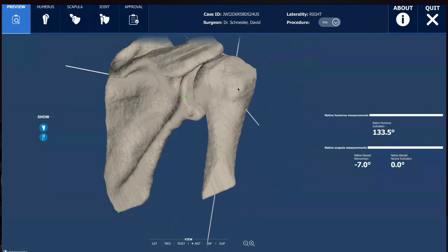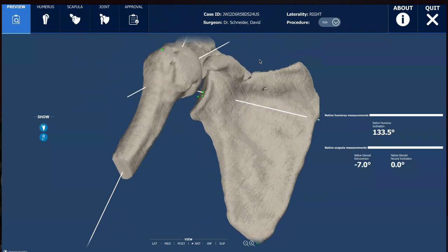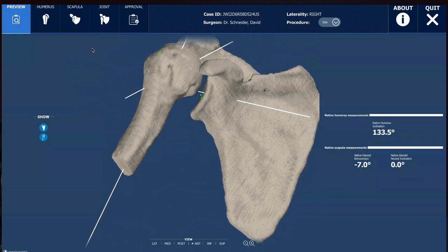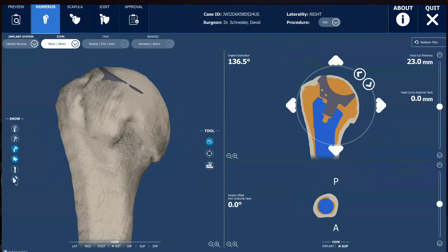So the next patient, this is another former college football player, great big man, still very powerful gentleman, aged in his early 60s. And he has arthritis, but he also has a massive rotator cuff tear. He can hardly use his arm at all. So again, I have not made all the changes because I want you to be able to see kind of what we think through.